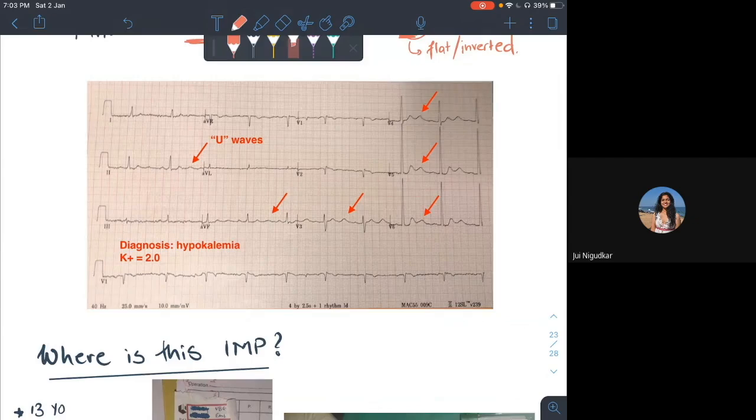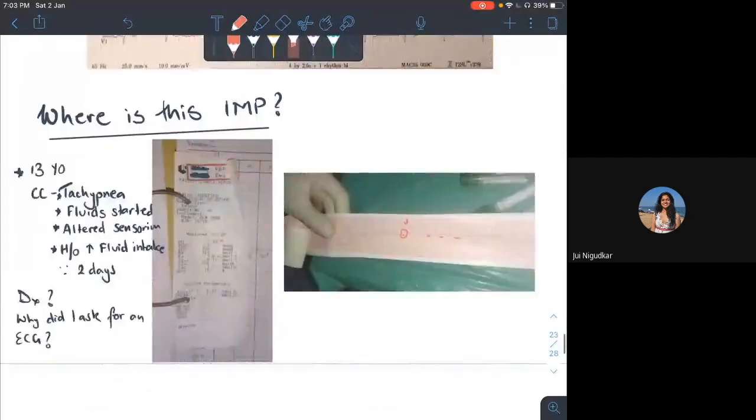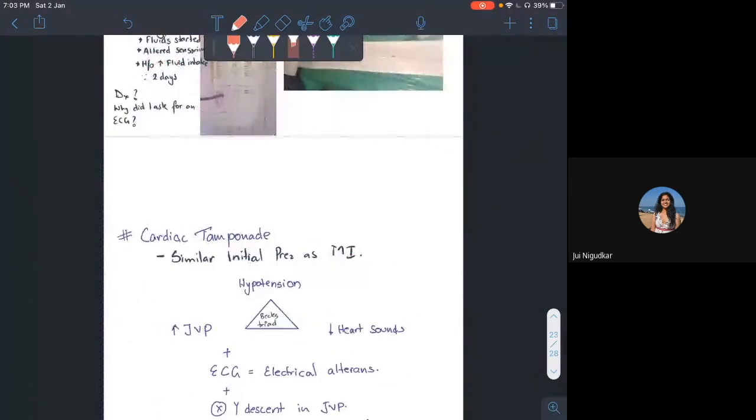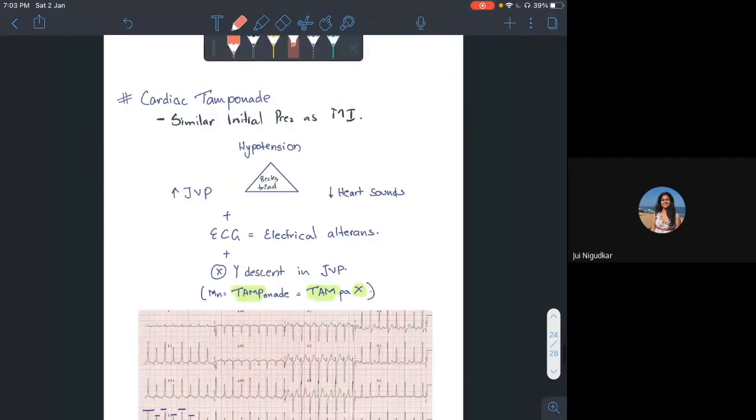It's just another wave which is beyond the T, and that indicates hypokalemia, where you need to start central line infusion of potassium, ideally at the rate which is usually 20 millimoles per hour. But you're really not supposed to be involved in the percentage calculation of potassium administration, because potassium, magnesium, all these other electrolyte drugs are extremely cardio sensitive. So you could induce complete cardiac atony or cardiac spasm if you calculate the wrong dosage. So always go to a resident for that.